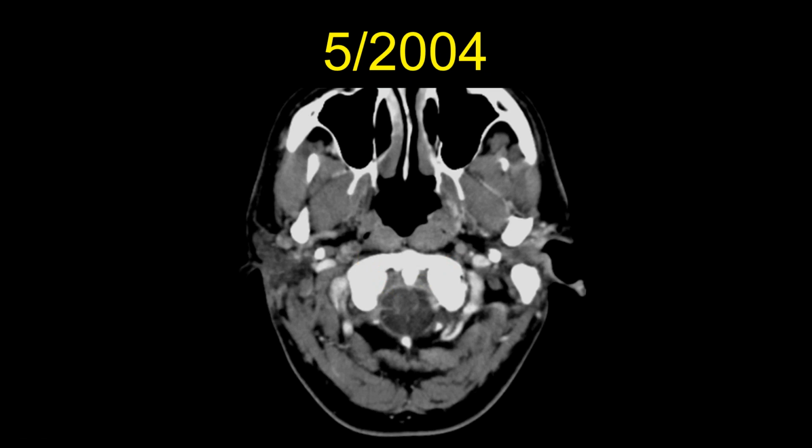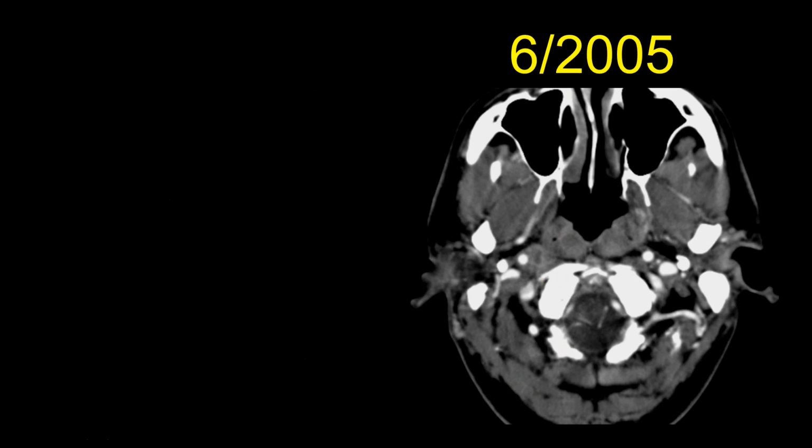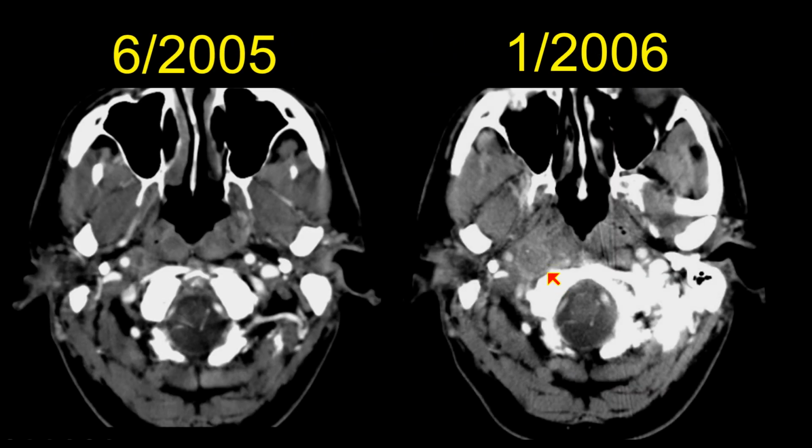And the next year, the patient came back, and they still had a sore throat, and they had a follow-up study done. And on the follow-up study, they still had a pathologic retropharyngeal node that was missed on this study. Unfortunately, that patient came back a year later, still for a follow-up examination, and they had another study done, and they had a positive retropharyngeal pathologic lymph node on that study. And they were still complaining of a sore throat that was getting worse.